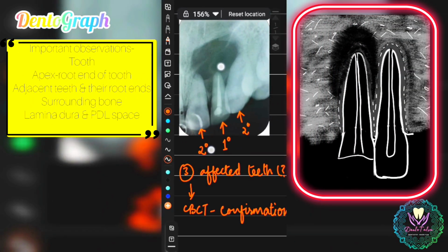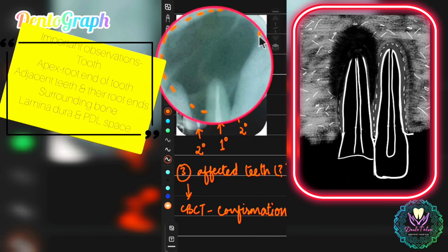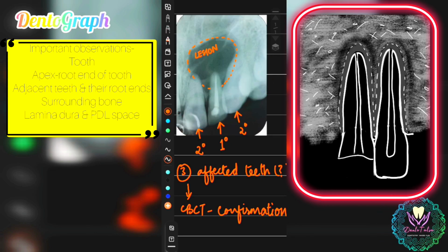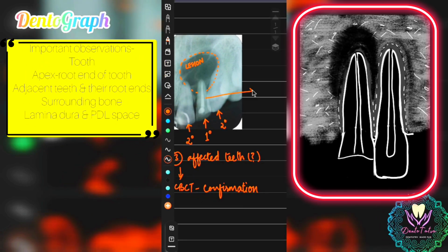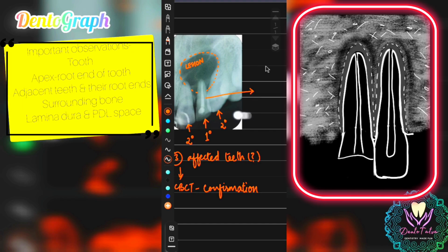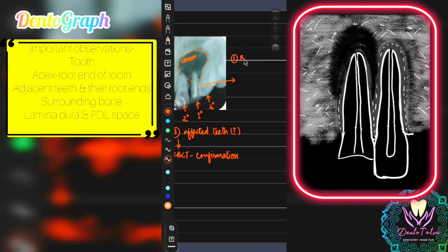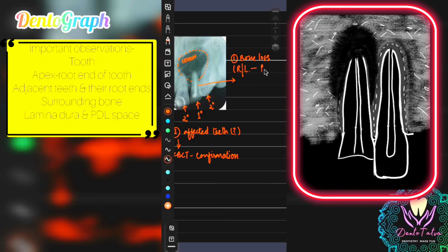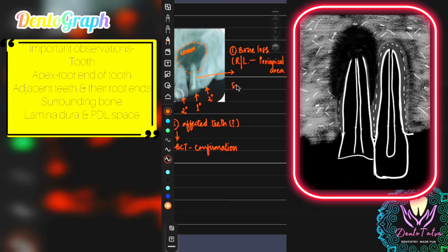The present radiograph is of 11, 12, 13, that is right maxillary central incisor, lateral and canine. And the circle of the infection, the main periapical pathology, is actually centered in relation to 12 at the periapical end. It is extending from the distal part of 11 to the mesial part of 13. So there is a high probability that if we do a pulp vitality test with a pulp tester, 11 and 13 along with 12 could end up being non-vital.